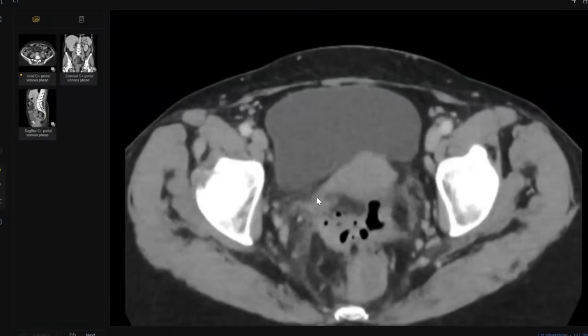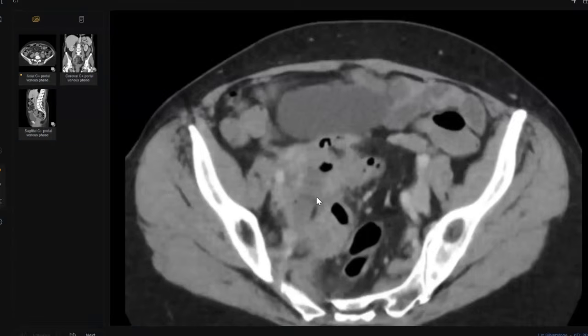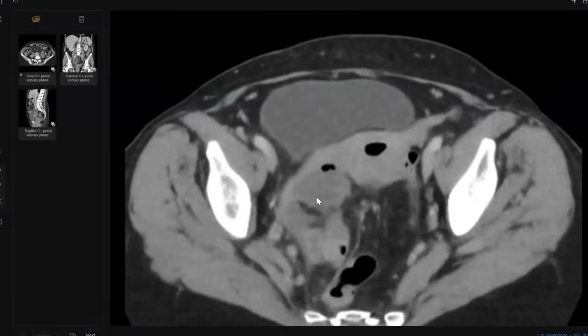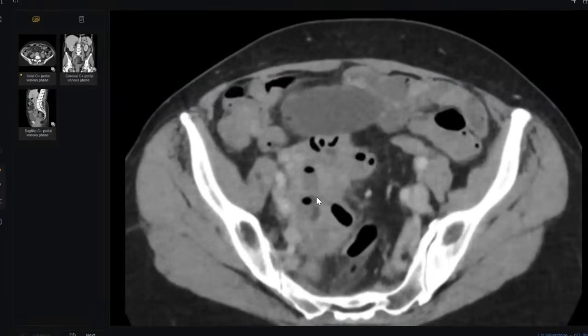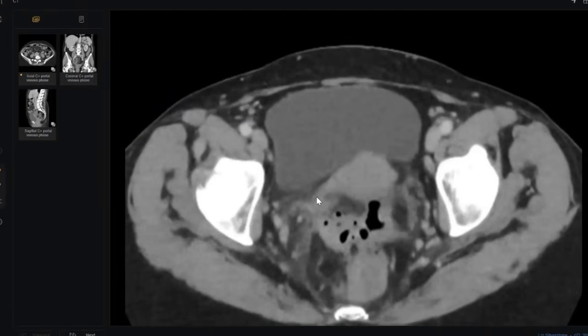Here, the urinary bladder would make it difficult by ultrasound. The urinary bladder would be in the pathway of the tube. So the best, from your opinion, is the posterior approach? See, posterior approach is very difficult here.